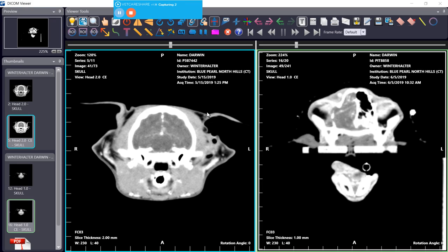Hi, this is Dr. Pamela Jones with PetCure Oncology, and I'm doing an imaging review for Darwin Winterhalter. A previous consultation was performed for this patient on video on June 3rd, and the CT images I'm reviewing are from a previous one that was done on May 15th and one that was done recently on June 5th.